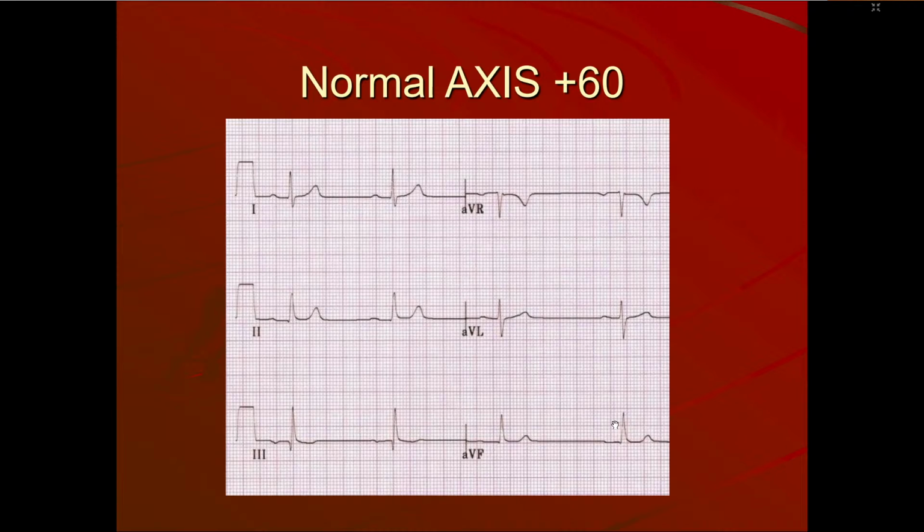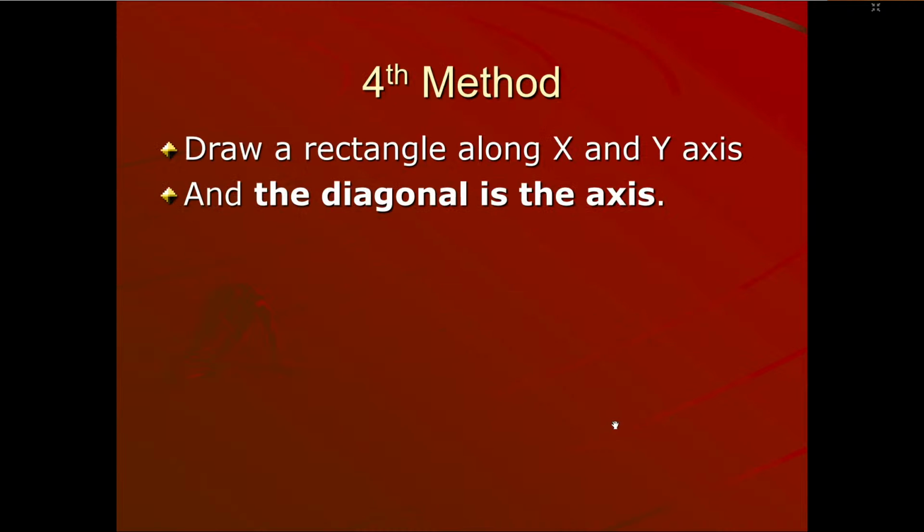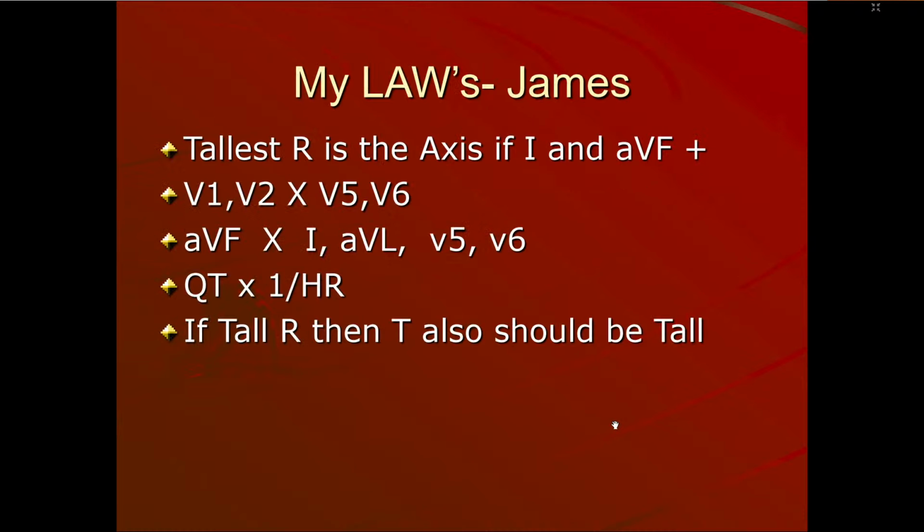It will be very accurate. Most of the times you will hit the right answer. But sometimes with this diagonal method, you might be a little away, let us say by 3 or 4 degrees. Then we will use the tan theta method. So I'll show you the tan theta method.